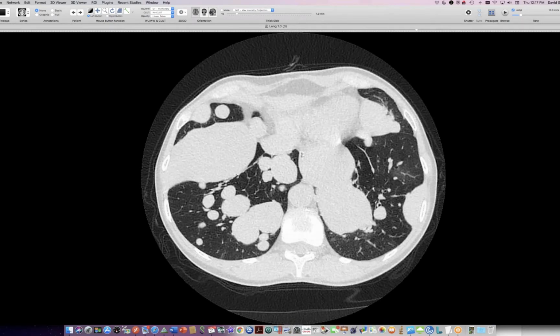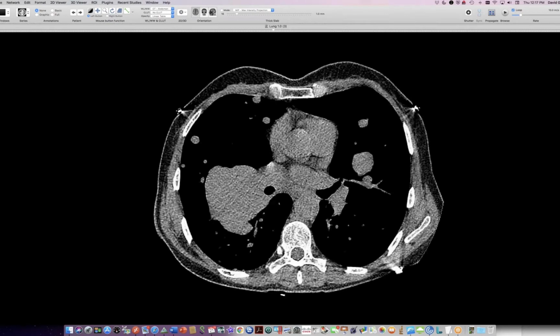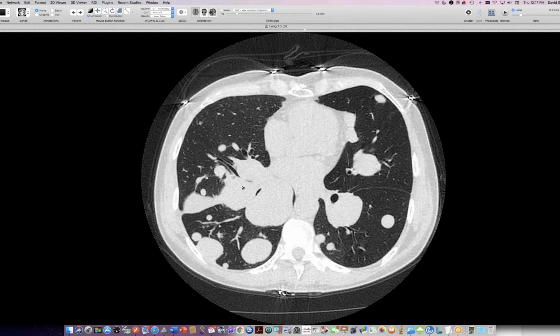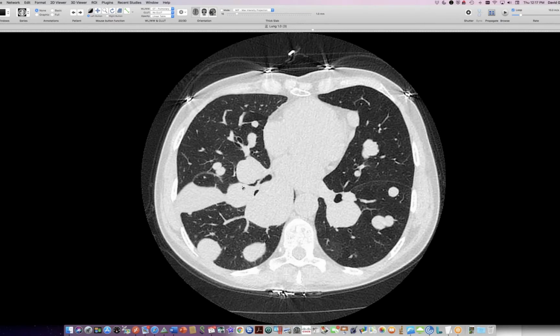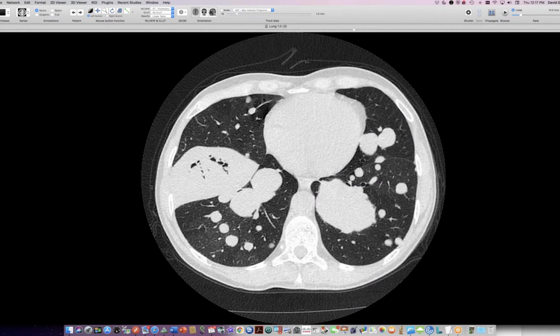We checked an abdominal CT scan, and this woman had had a hysterectomy. There is a needle biopsy confirmation, which I've not reviewed, but I was told about, that shows that this is benign metastasizing myomatosis. So many lesions. I don't think I showed a case a few years ago, but it wasn't as dramatic as this one in terms of the number of lesions.